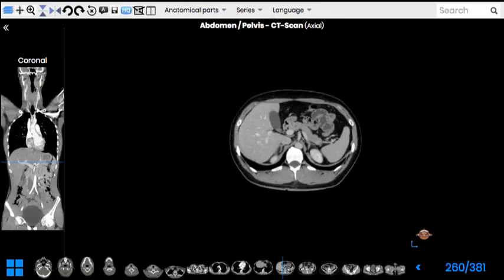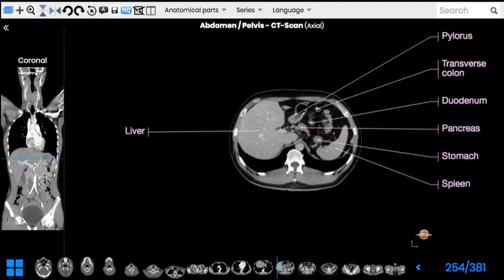One more important feature in interpretation of computerized images: we look at them from the bottom up. That's why right and left sides appear on the opposite sides. For example, this is the liver, and it seems like it is on the left side, but if you are standing below this line and are looking up, then it is on the right side, as it must be. So this is a fact which we need to keep in mind when we look at the CT and MRI images.